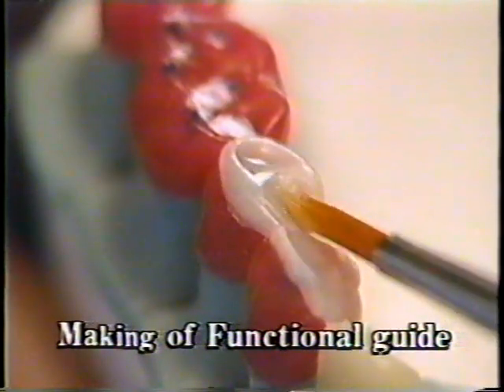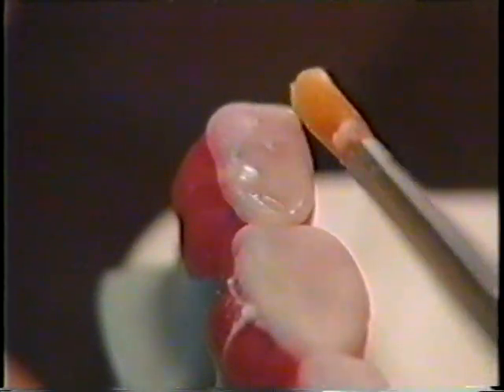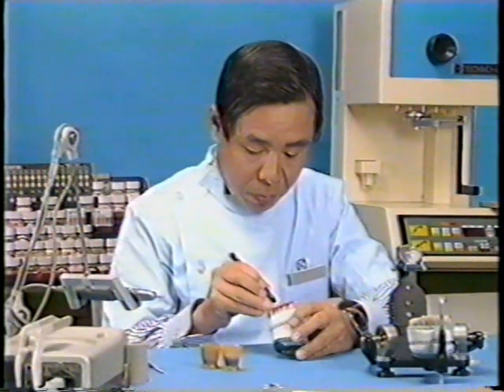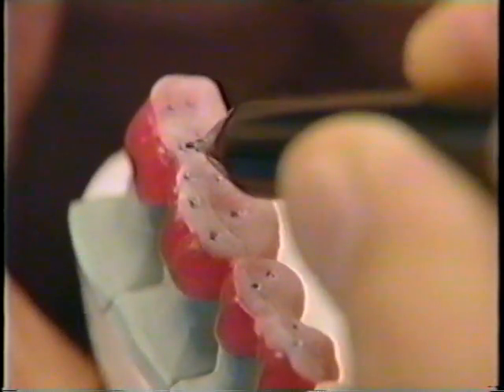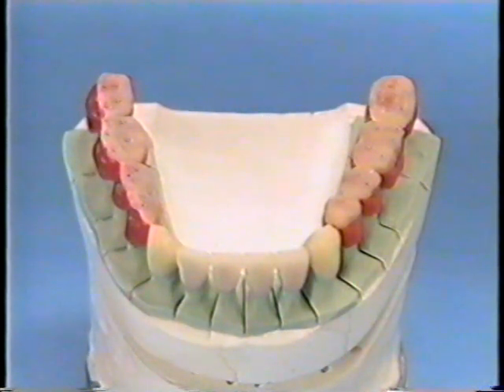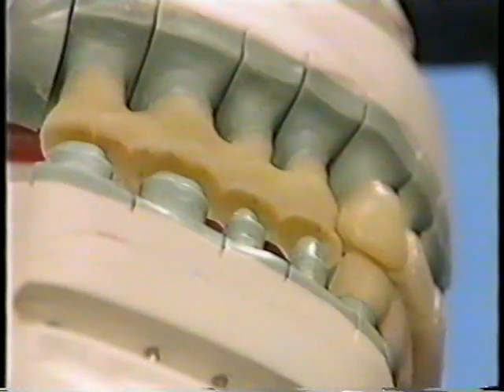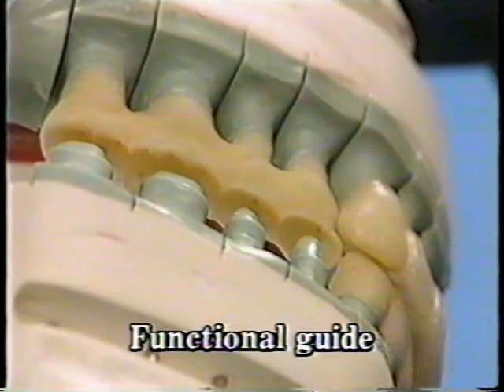We'll record information about the contours of the mandibular occlusal plane and the positions of the molar cusp. This then will enable us to begin ceramo metal construction.